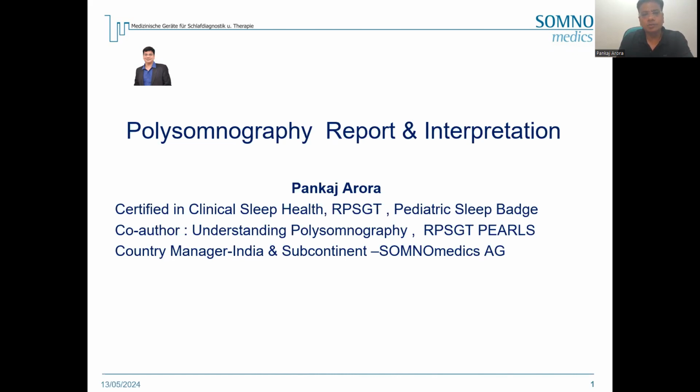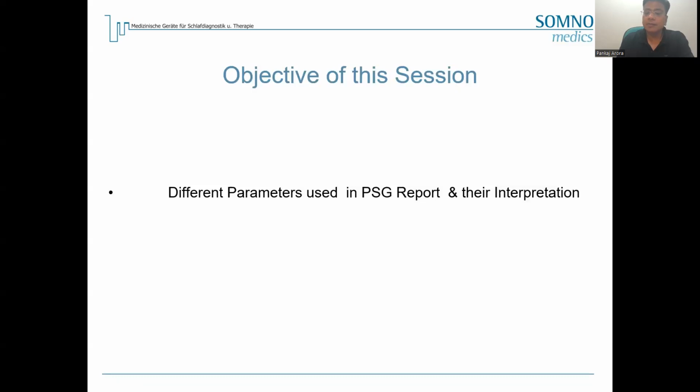Today I'm going to speak on polysomnography and its report and interpretation. The objective of this session is to look at the different parameters used in a PSG report and their interpretation.